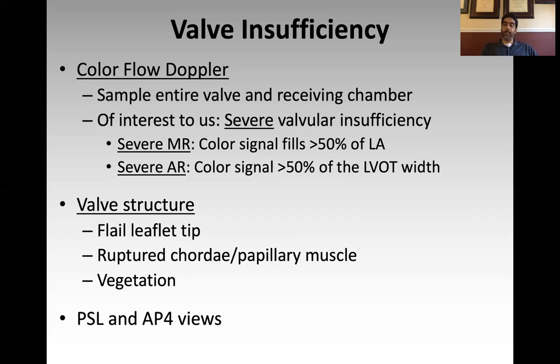Okay? But if you see something like this or something that's approaching this, order a formal echo, because this is a complicated evaluation as a whole. Okay. So severe valve insufficiency, quick and dirty assessment. This is our job here.